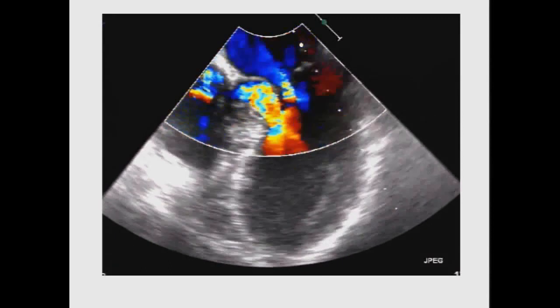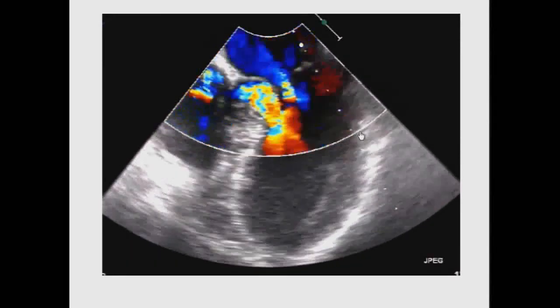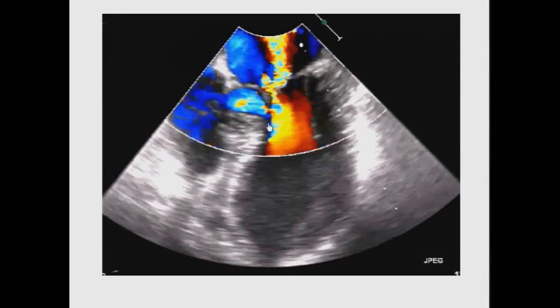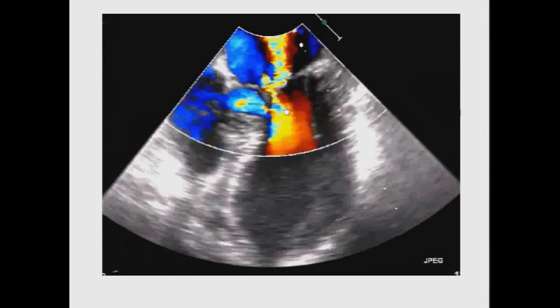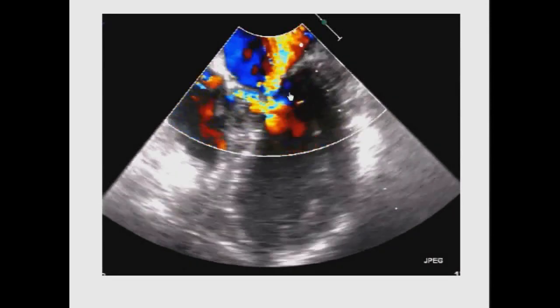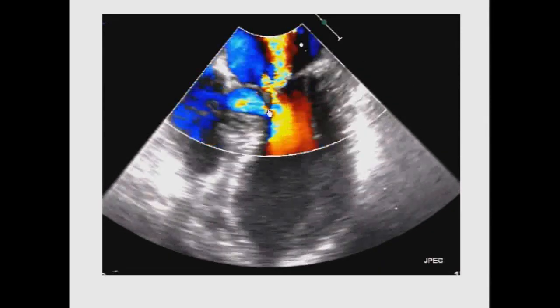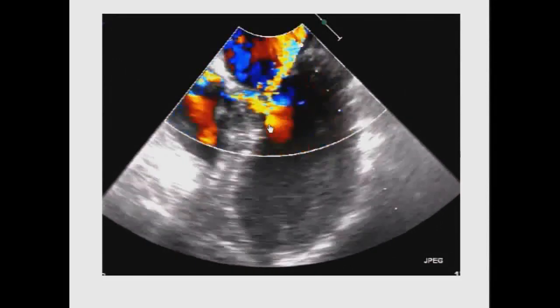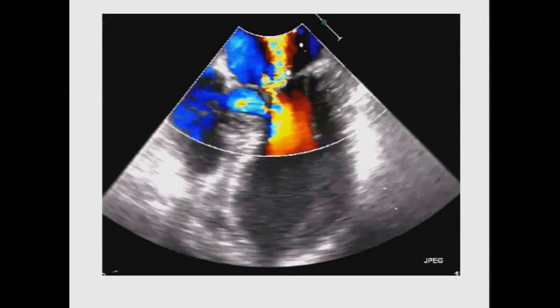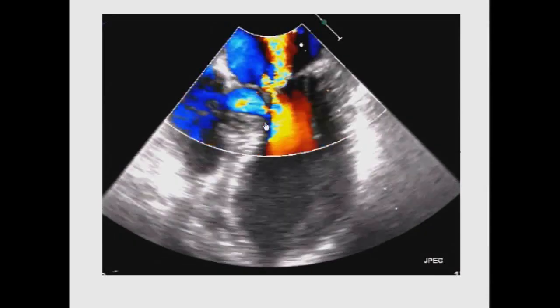You will be inundated with data at this course on hypertrophic obstructive cardiomyopathy. This will be covered in much detail, but suffice to say that it's sort of a twin double whammy. You have obstruction to outflow, and because the anterior leaflet of the mitral valve is pulled into apposition with the septum, you have mitral incompetence, and you have this cycle of eject, obstruct, and leak in that order.